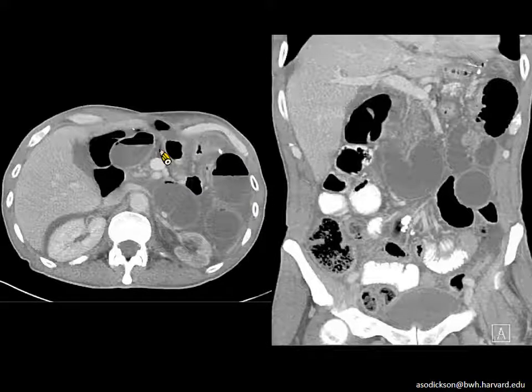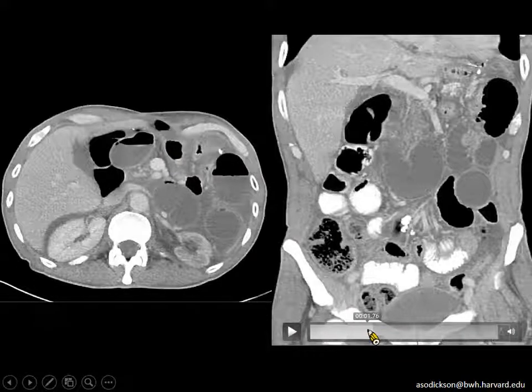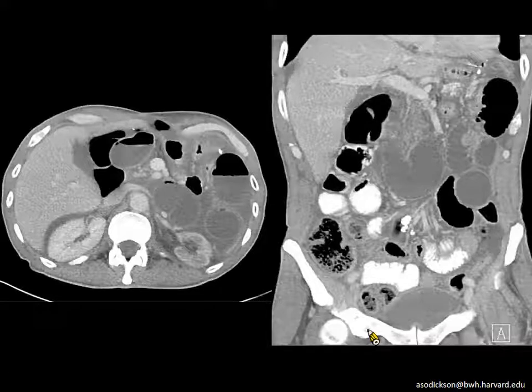So the only way to drain this distended bowel loop is to treat this surgically, unless you were willing to put a percutaneous drain into the bowel through the skin, which nobody's interested in doing, because then that makes a hole in the bowel that tends to stay there. So this is also a surgical emergency, closed loop bowel obstruction from a gastric bypass patient.